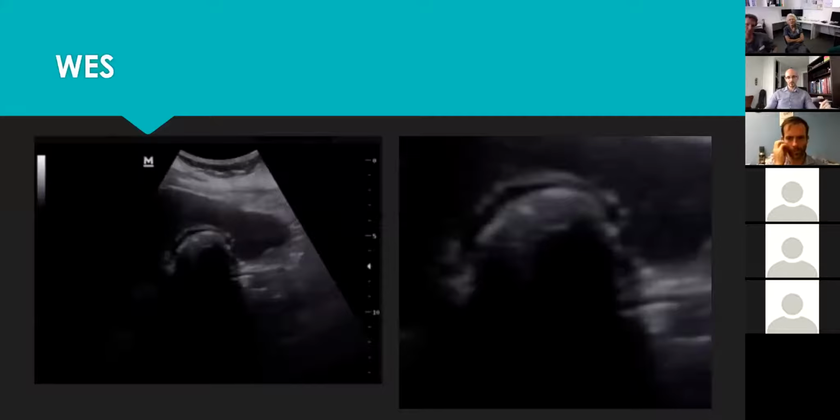But before we get to that, this is another common question. You will see this image and you can see, for example, this would be the liver. And this might be an obvious one, but in less obvious ones, you might think this is a contracted gallbladder and that being the bowel gas after it. But actually, this is a very, very huge stone, pretty much completely obstructing, filling out the whole gallbladder.